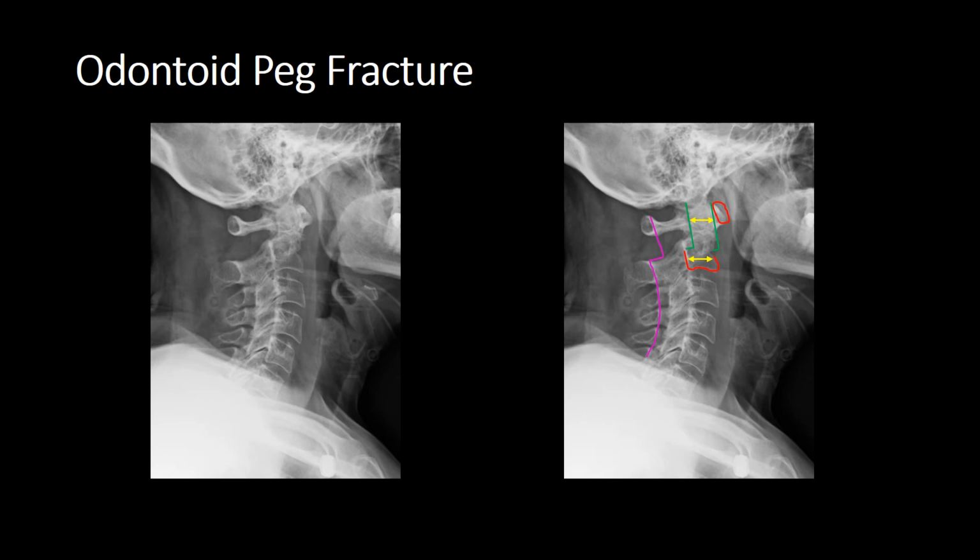Okay, so A is alignment. So we come down our anterior vertebral line. Oh, there's a step. There's a step there in the cortex. Come on down. No problem there. Let's go up the posterior vertebral line, coming up. Oh, step.